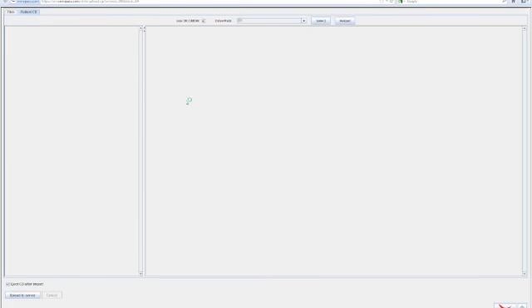upload feature. This is, again, a Java-based tool that we've included in every account, so people will be able to upload their own studies. And what it'll do is you can select either your CD or your DVD drive on your local computer, and it will scan that drive looking for Dicom images. And it will discard any other files on there that aren't Dicom. So you don't have to worry about uploading the built-in viewer or any other JPEG images or anything non-Dicom. Everything is going to be Dicom.